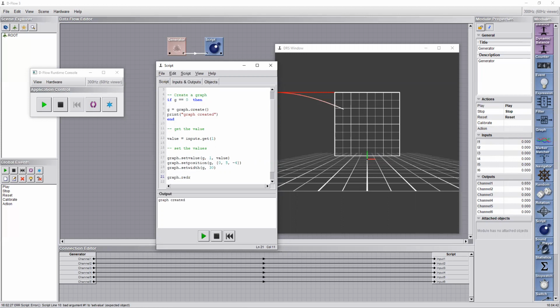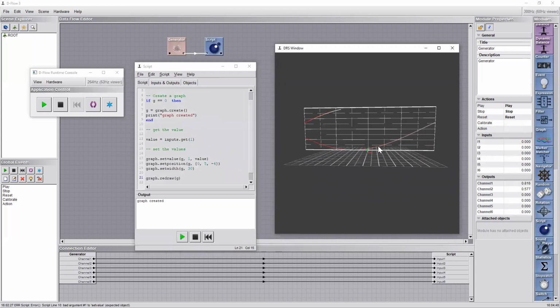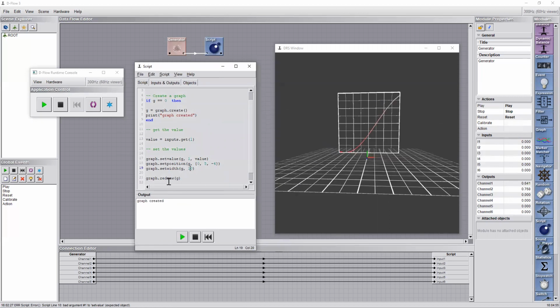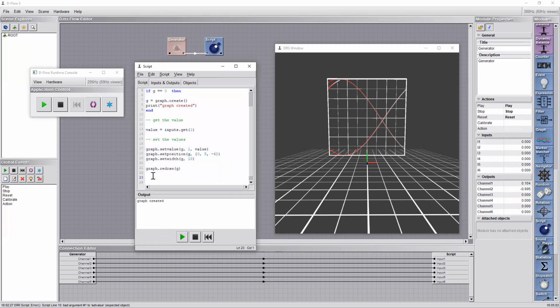Redraw, how do you write it? Draw, I guess like that, okay? Redraw things. So basically when you do that, then it creates the proper one. Make sense? So if you don't do that, let's say 10 is there. So it's correct. If you don't do this part, you notice what happened. You can make changes to alter sort of things details, but I quickly finish it off with the title.